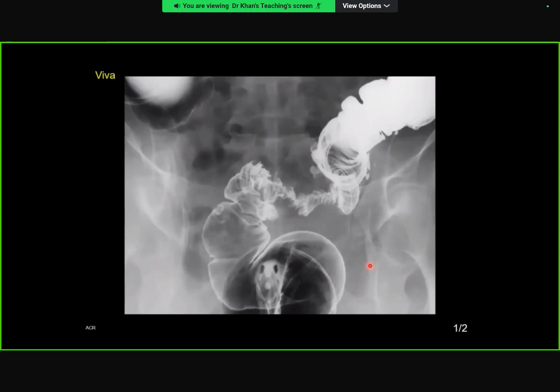I cannot see the rest of the bowel. Visualized descending colon appears normal. So there's abnormality centered in the sigmoid colon, with the very thin, string-like stricture. It's a short segment. So differential here could be malignant stricture, or if it's a part of the disease process, then it could represent an inflammatory bowel disease. But I'll have to see the rest of the images.